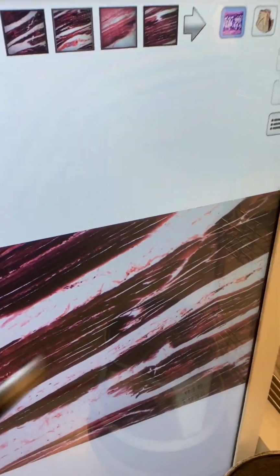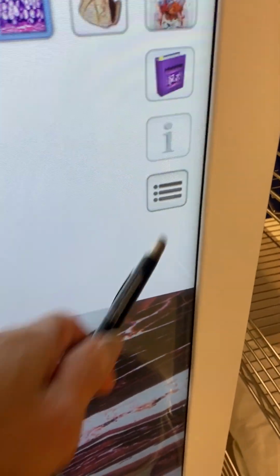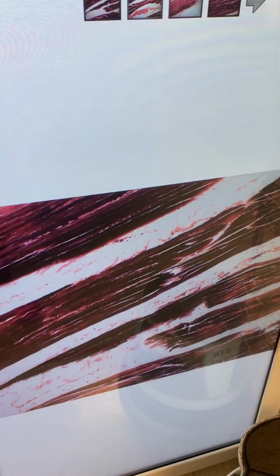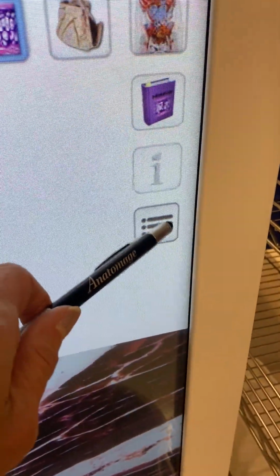I did try it already. I wanted to test it out. I did try that icon, and it was active when I went to the heart cells, tissue of the heart. It was showing me cells of the heart specifically on the image. I was able to turn that on by tapping on this one. But the image I chose right now is not interactive.